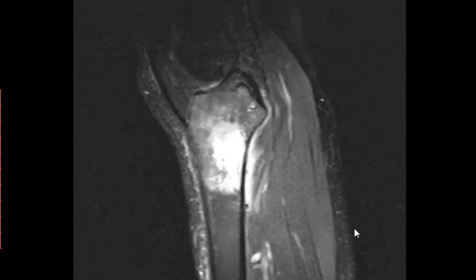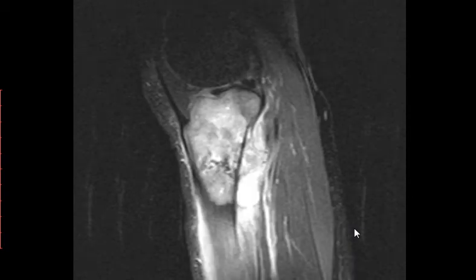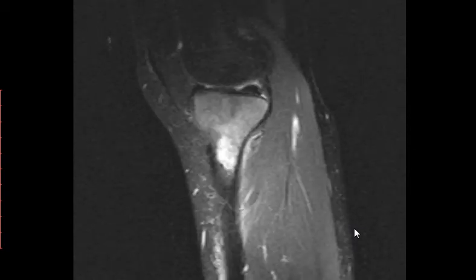Yes, but it is extending to something, where? On the posterior portion, we will come to that separately. Let's stay with the original lesion. Extending to where? Intra-articular, to the articular surface of the tibia. Okay, so it's from the proximal diametaphyseal region, extending to the articular surface.